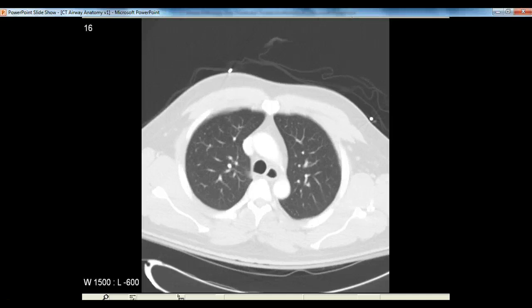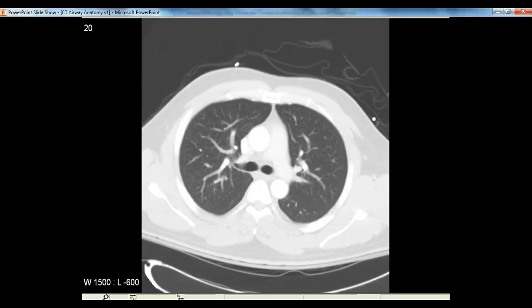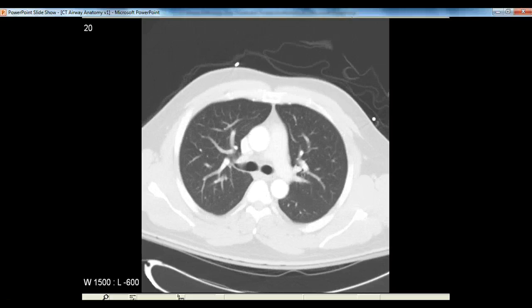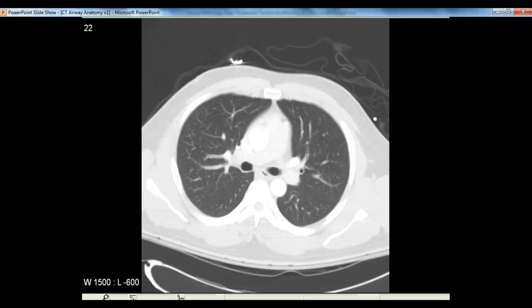And now we're seeing another structure opening up next to our trachea. Well, what's that? That black structure just to the left of the trachea. Well, that is just above the split, the carina, where the trachea divides into the two main stem bronchi, a right and a left, and the left comes off at a flatter angle, the right is steeper, and that black thing there is a secondary bronchus that takes off from that primary bronchus right after the split.